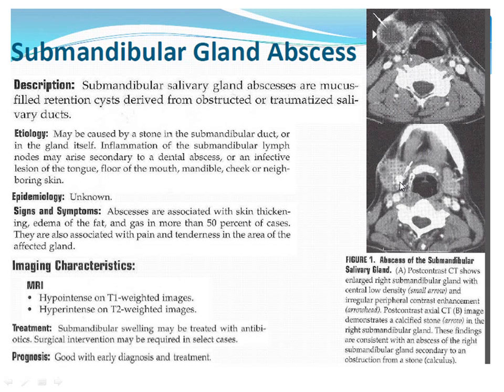On MRI, it's a little bit harder to diagnose the sialoliths, to diagnose the stone as the cause. Of course, they're going to be low in T1 and T2 weighted signal, but if you saw these kinds of abnormalities on MRI, you may even have the patient go on to a CT for further evaluation, which is funny because it's usually the other way around. Sometimes if there's an abscess, they may have to drain it surgically, or percutaneously put a needle in it and drain it. Or they may just give antibiotics.